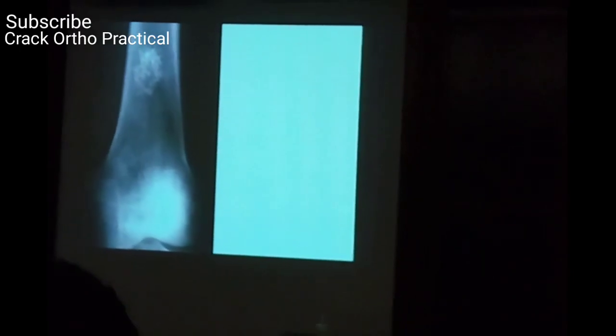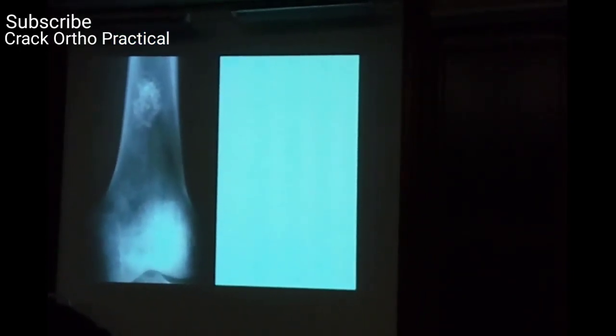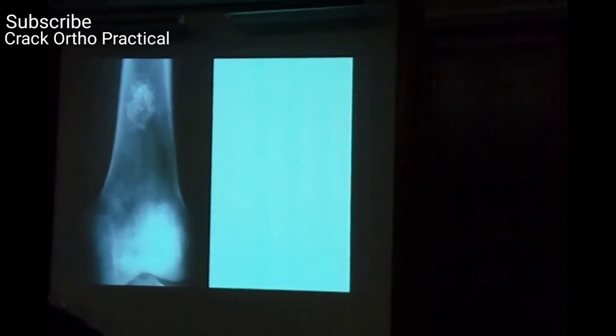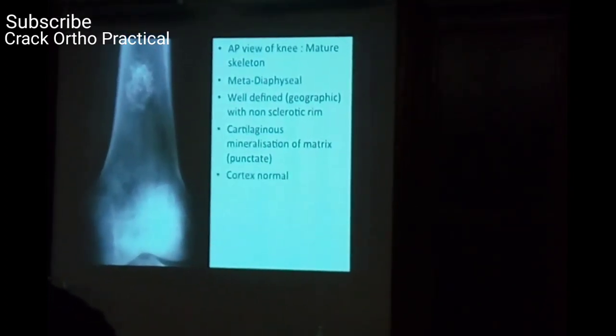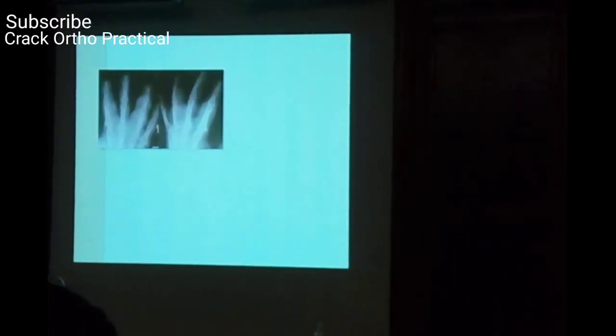There is no periosteal reaction. There is no soft tissue swelling. So mostly indolent. Good. Who will take this?